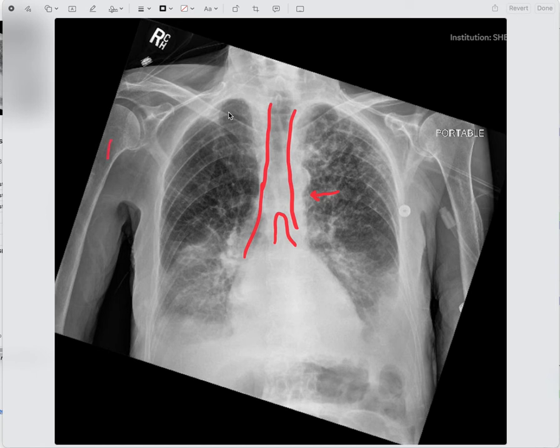So bones, we look at all the bones that are visible and don't see any fractures, ribs are okay, etc. The vertebrae, what we can see looks okay. I don't see anything unusual. And C for cardiac silhouette, you can see the silhouette here, good. You can see the silhouette here as well. And obviously, if parts of that were blocked by something, that would mean there's an infiltrate or consolidation or something going on there, which you'd have to figure out what it is.